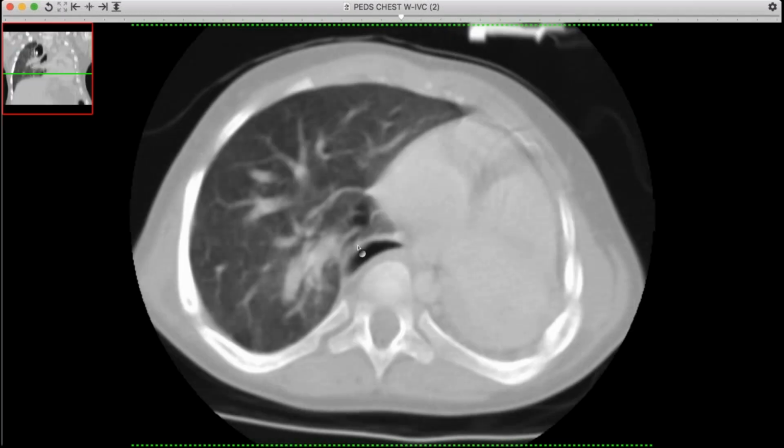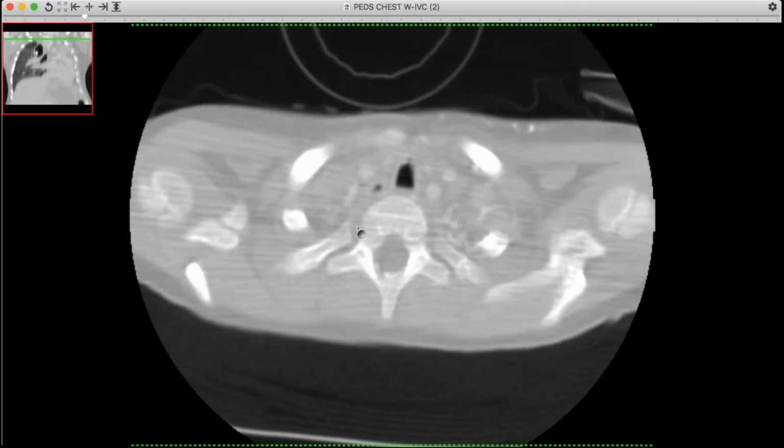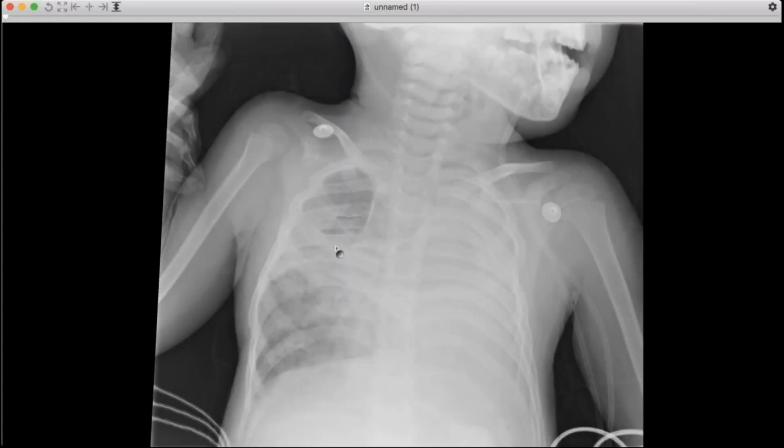I don't know, he has some weird esophageal dysmotility. I don't know if he had some problems as a child or something. I didn't dig around too much in this case, but just a nice pulmonary agenesis. And I don't know why he had these rib fusions there or anything. Maybe it looks like a thoracotomy defect. So maybe he had a TE fistula or something when he was born. Oh, yeah, maybe.